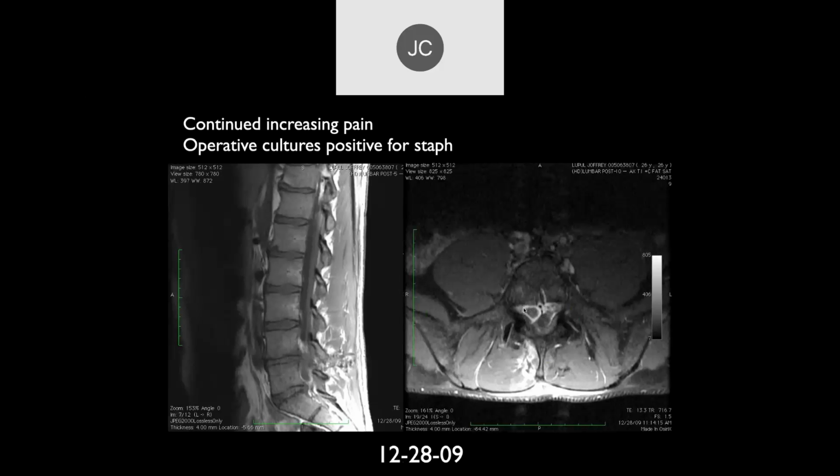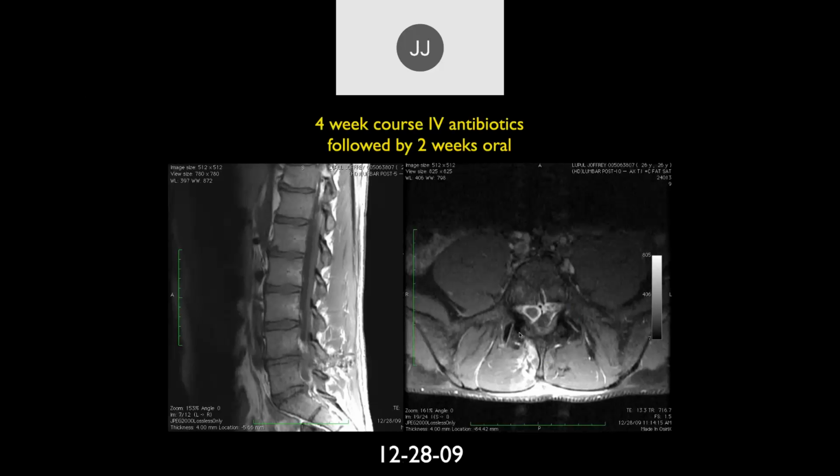Okay. Yeah, that looks like an abscess. Hematomas improve with time unless they're infected. So if you have a hematoma that's got infected, that's pus.